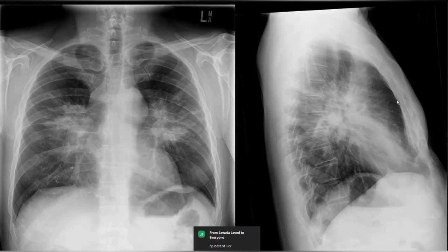And what do you think about this opacity below the airways? Whenever you have opacities over here on the lateral radiograph, that's the infrahilar region. Always think about lymph nodes, right? And what do you think about the surrounding parenchyma over here? It's kind of all stretched out, mild.